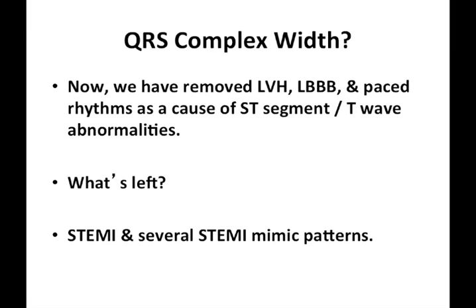So, as of questions 1, 2, and 3, we have determined that ST elevation is present in at least 2 leads. In question 2, we've determined that this ST elevation is not related to LVH. In question 3, we have ruled out the presence of left bundle branch block and pace patterns as a cause of the ST elevation. So what's left? STEMI and several other non-STEMI patterns that can mimic the appearance of heart attack.